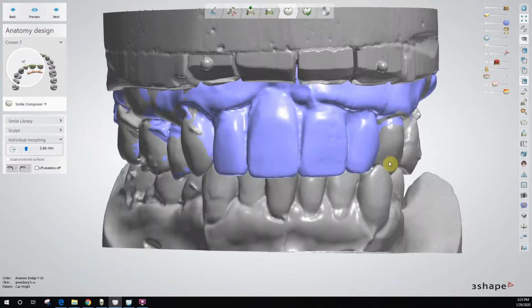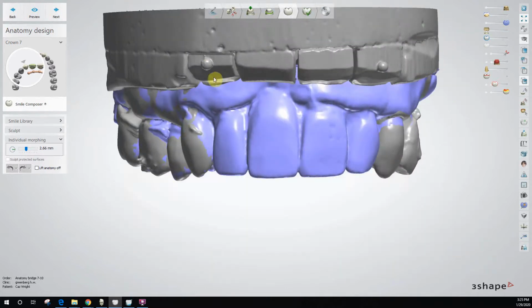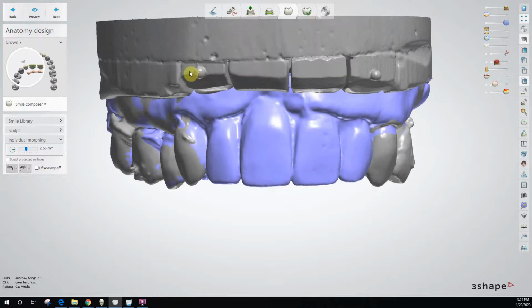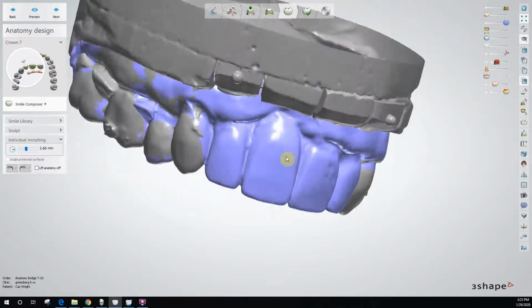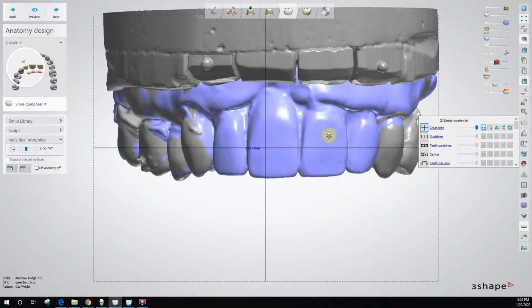It could be just some corruption on the side, or it's not quite a good, accurate model. Okay, now these two dots for this company that I designed for are a level, telling me I put my line right through the center of that and right through the center of this. And what that does is it gives me a level point this way or this way to prevent cants, the patient's teeth rising upward on one side or the other.